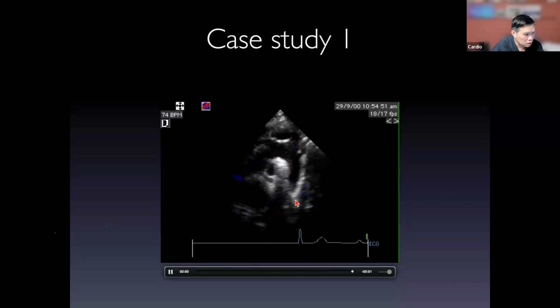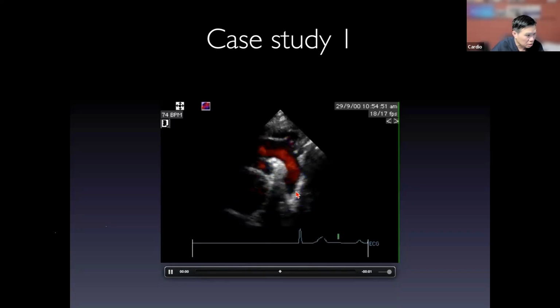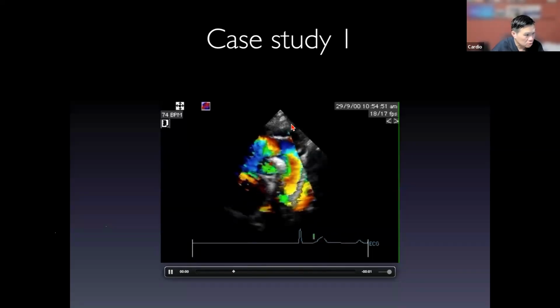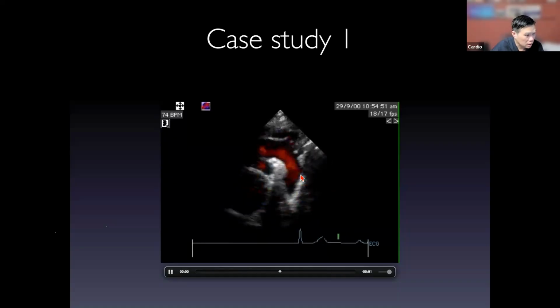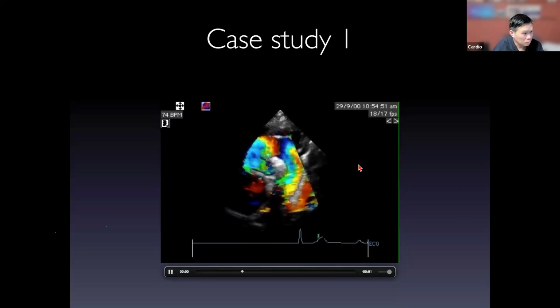If this is less than 45 degrees, then the reflection is there. If the far wall of the descending aorta is more vertical, more than 45 degrees to the main axis, then the artifact is gone. So it's really depending on the mirror, just like when you go into a mirror house in an amusement park.